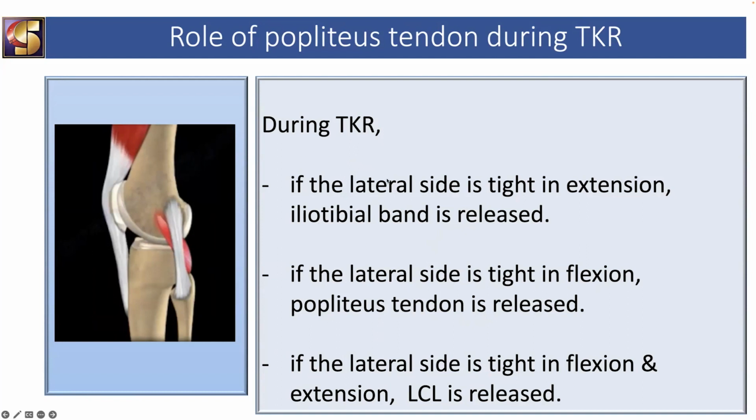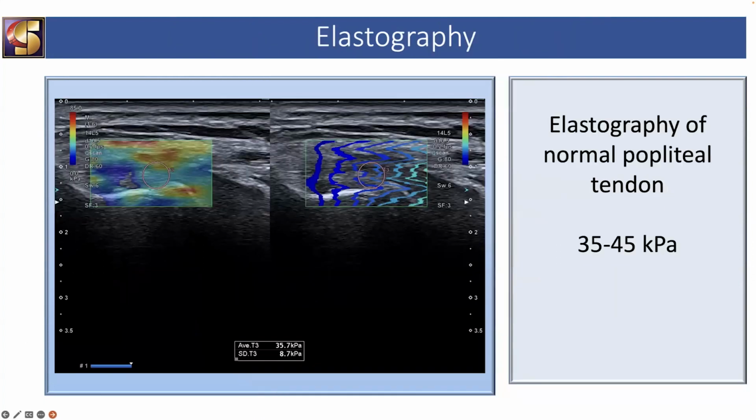So we should be aware of these things while evaluating a post-operative post-TKR knee, because for all the pictures which I showed previously, I was not aware of these things. Only after reviewing the literature, I got these answers. Why we are seeing different pictures in different patients of the TKR involving the popliteus tendon and the myotendinous junction.